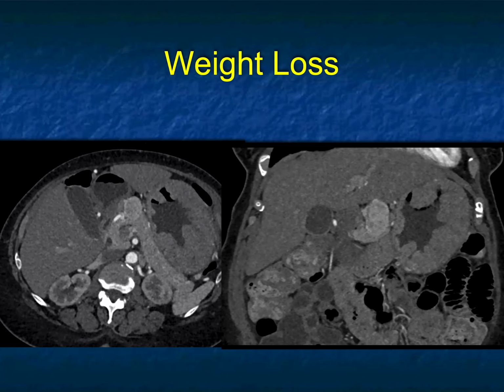Patient with weight loss, what do I see? I see markedly thickened gastric folds: Menetrier's disease, lymphoma, bulky adenocarcinoma. But then I see a mass in the body of the pancreas, which is vascular, which means I'm dealing with a neuroendocrine tumor. So now you say to me, neuroendocrine tumor and big gastric folds, then I'm saying functioning neuroendocrine tumor and a gastrinoma, which gives very large folds. Remember, patients with MEN1 commonly get neuroendocrine tumors, which end up being gastrinomas. A beautiful example of really dilated gastric folds and a gastrinoma. Great case.